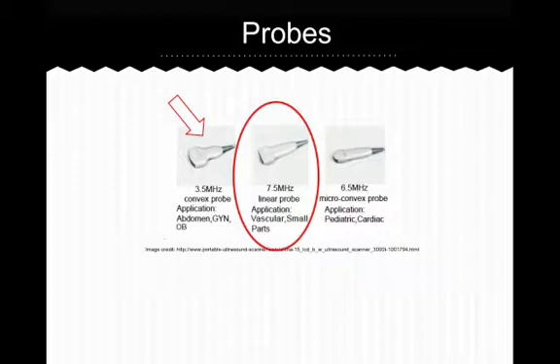The high-frequency linear vascular probe, also called the linear probe, produces a rectangular image. It sacrifices depth penetration for better resolution. Thus, it is good for visualizing more superficial structures like vessels. It's good for obtaining vascular access and ocular and lung ultrasounds. We will emphasize this probe because it is the best one for visualizing bony fractures.